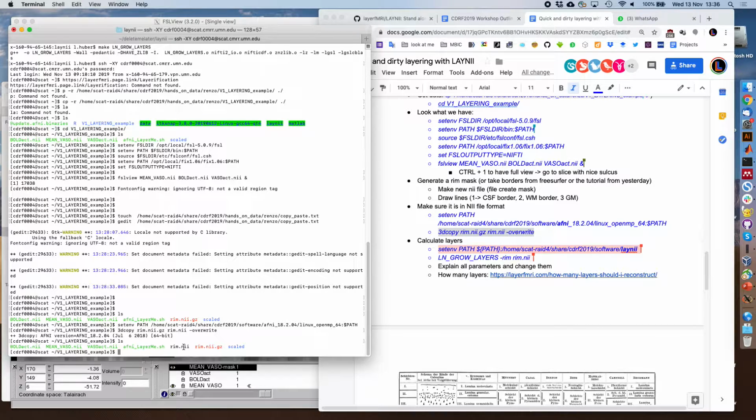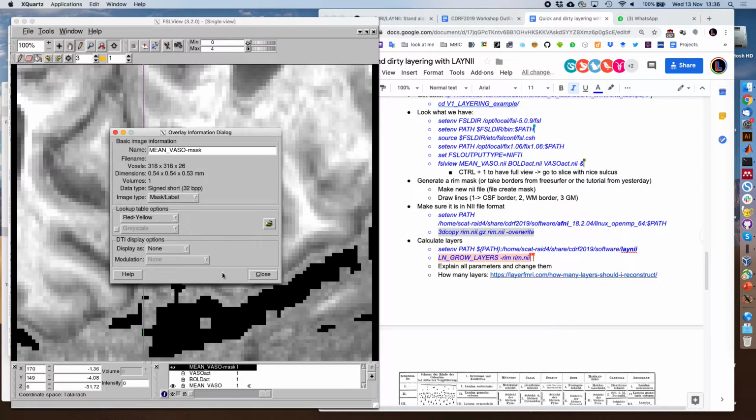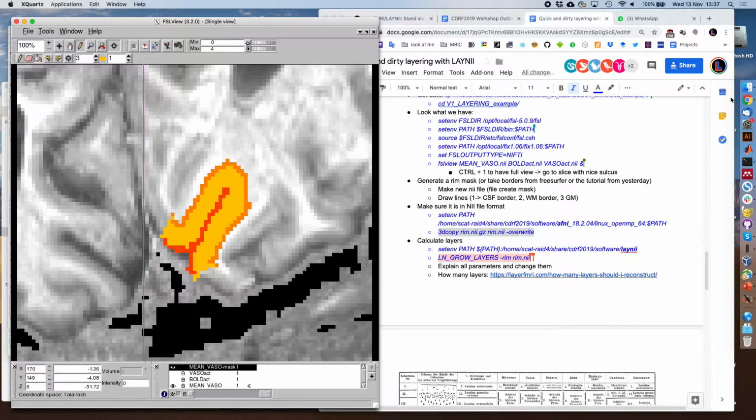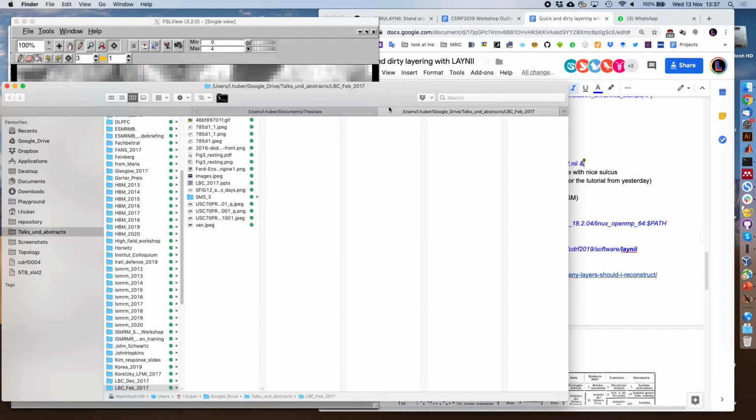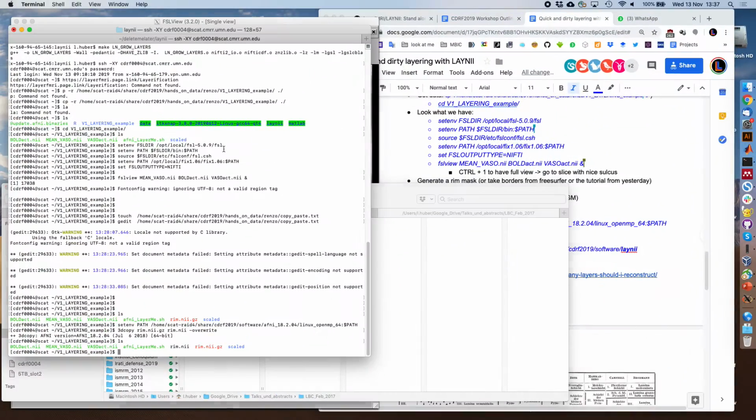So you just unzip it? You could. It comes along with challenges because of the file type and the way the nifty header is. In the nifty header, you have a slope. I can show you what it does. I need to mount it real quick.